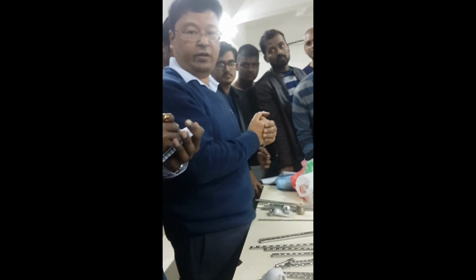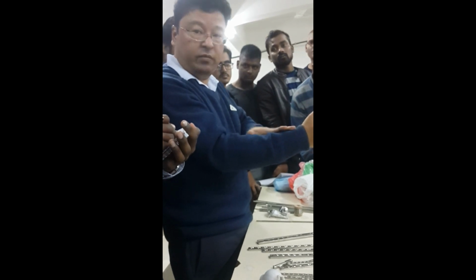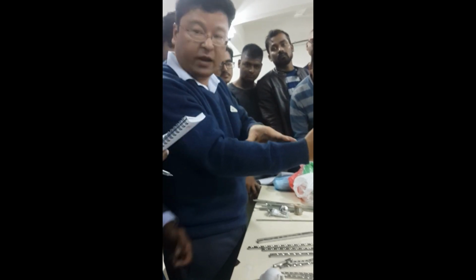when you fall down, the bone might just break. You have to take care. That's because everything was borne by the plate.